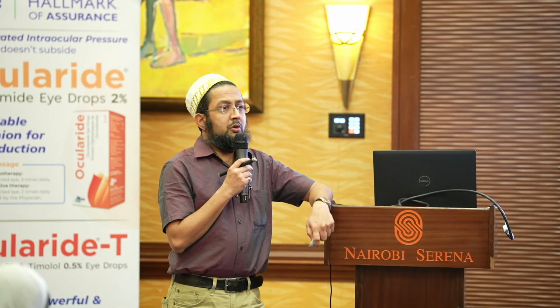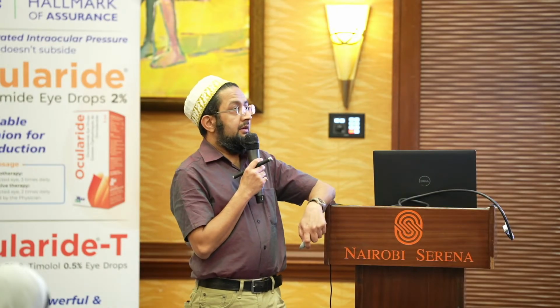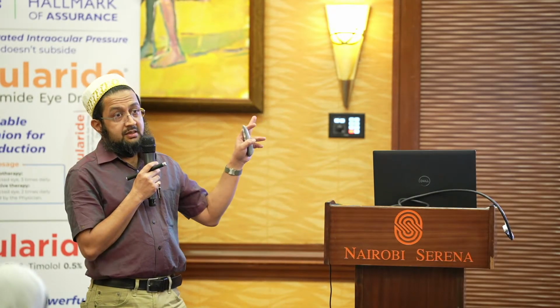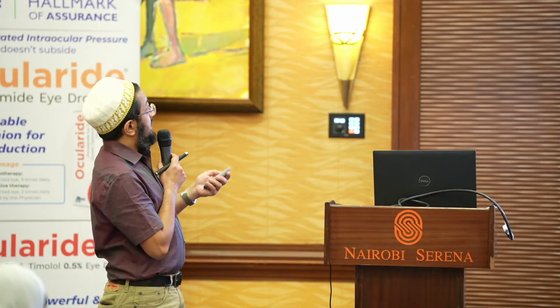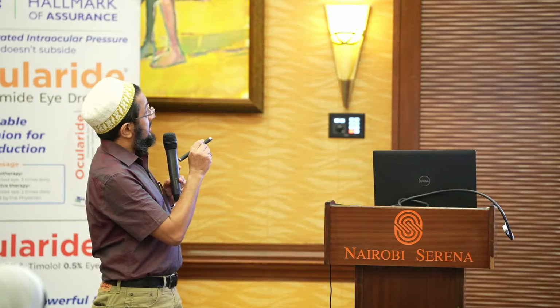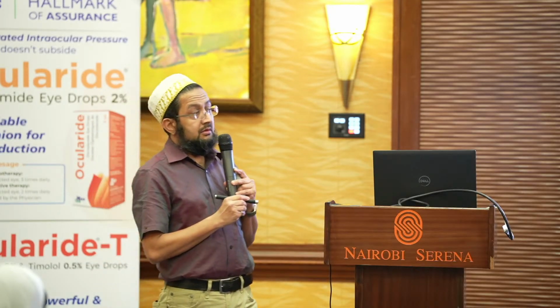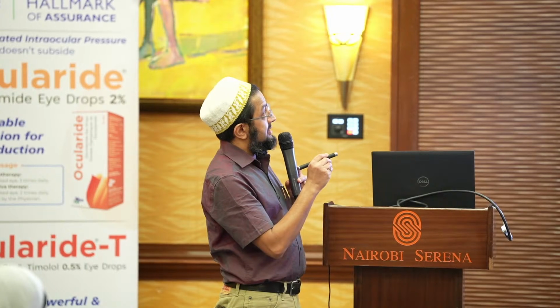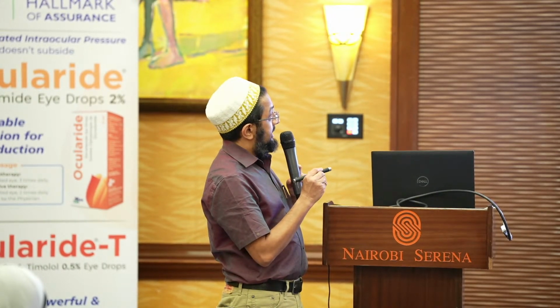Now, this is a patient who had been referred to me. He comes from northeastern province. A young gentleman came with reduction of vision. He actually had a detachment in this eye. There's exudative detachment. And these are photos which are taken from my phone. So you can see here, this is a subretinal abscess. Over here also you can see there's a subretinal abscess nasal to the disc and at the macula.